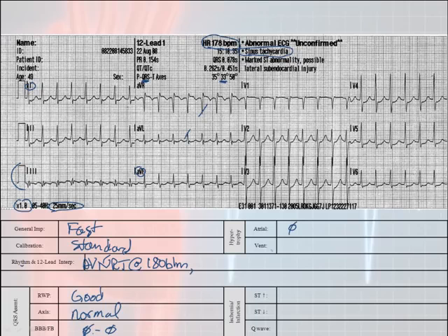How about ventricular hypertrophies? I could determine that. So let's look over here at V5 or V6. V5 is bigger, so I'm going to say 5, 10, 11, 12. Here's my baseline. How far down do I go on V2? 5, 10, 15. So that is not going to be greater than 35. So I'm not going to have any left ventricular hypertrophy, and the QRSs are both pointed down in V1, which means I don't have any right ventricular hypertrophy, so I have no ventricular hypertrophies.